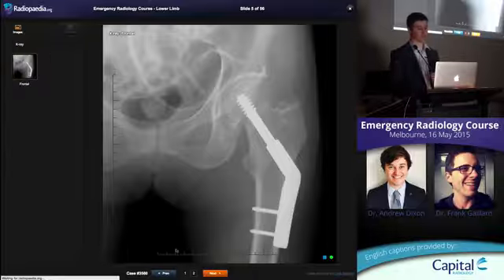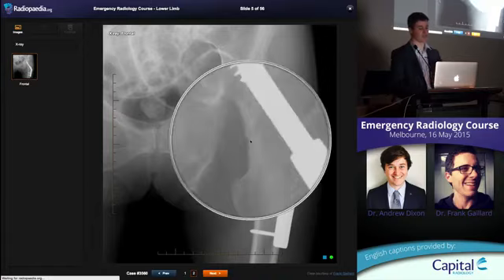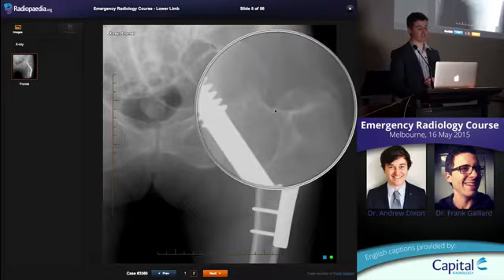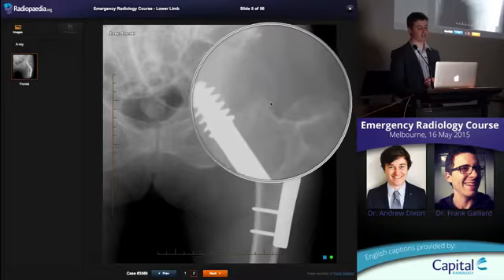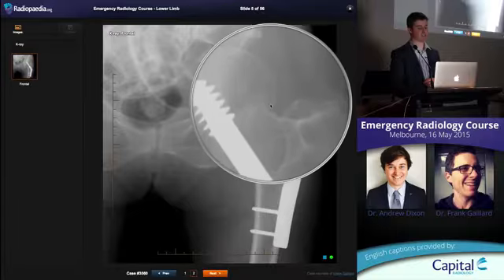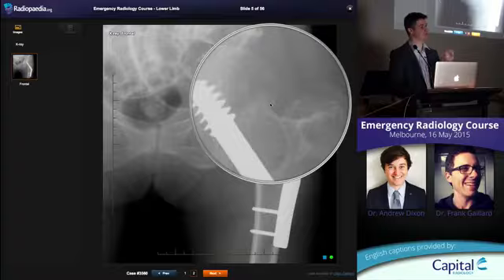a dynamic hip screw. There's the dynamic hip screw. You can see by the time they've done that repair, the fracture line becomes a little bit clearer to see. That's the important thing to recognise. See that? The head, the neck comes up, and where it joins onto the head, you can see there's a little bit of impaction, sclerosis here, and the cortex, there's a little jump in the cortex. That's the subtle findings you're looking for in a fracture.